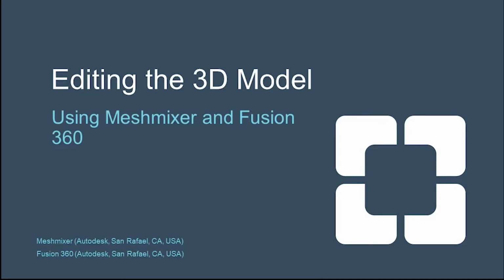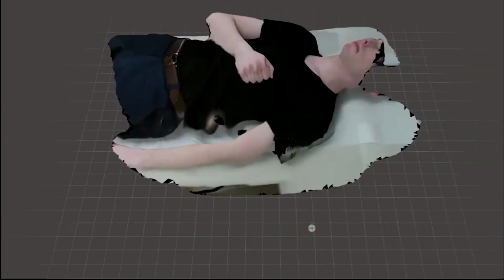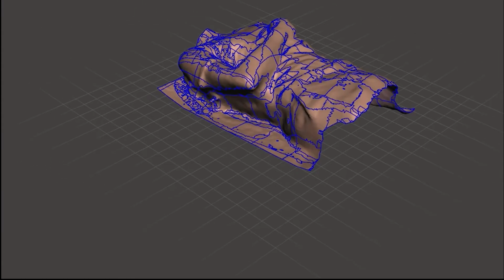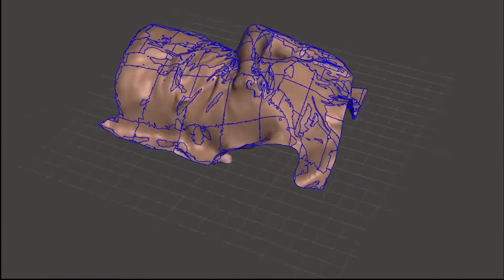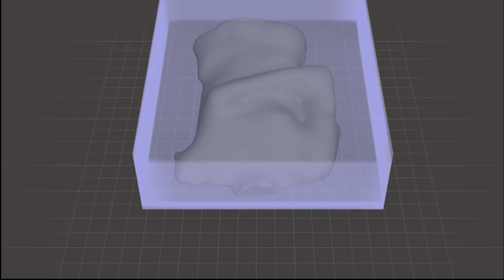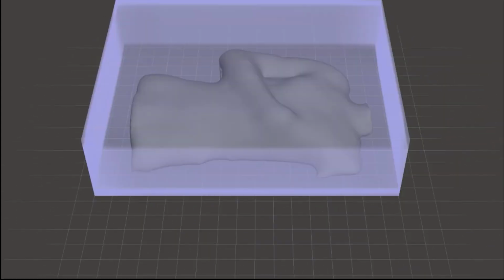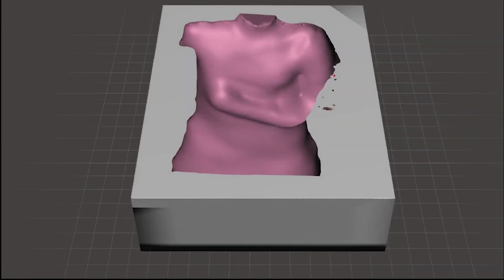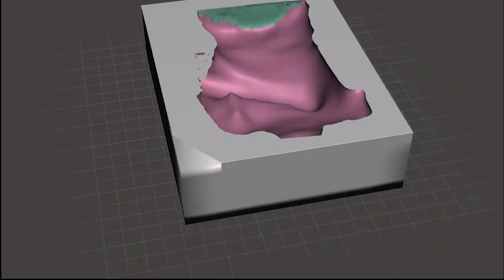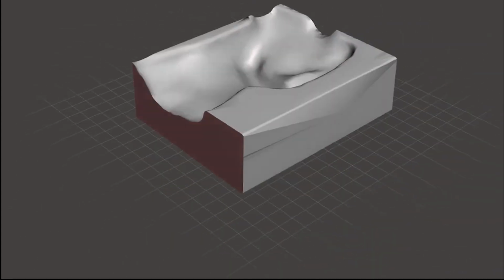The 3D model is then imported in Meshmixer for further editing, with several stages of processing, including closing any gaps in the 3D model, removing excess material such as the patient bed that was recorded during the scan, smoothing any jagged edges or artifacts, using a Boolean difference operation to subtract the patient's body from a cube representing the foam material, and removing any overhangs from the foam cutout model that cannot be CNC machined using a drill bit operating straight down. And finally, we reduce the number of triangles and details to speed up later processing steps.